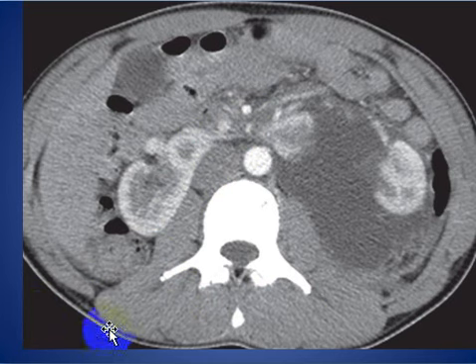And here in this axial CT scan, the patient has a presence of horseshoe kidney with parenchymal isthmus, as we see here, and a large amount of fluid in the left perirenal space. And there is a laceration of the left kidney, left upper moiety in this area.